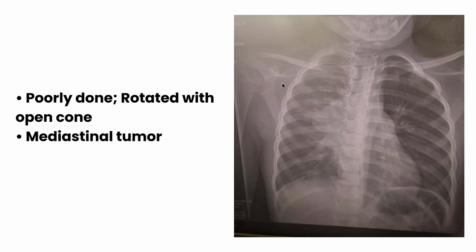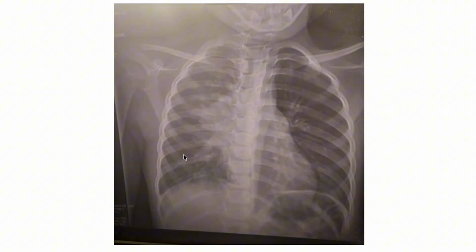In this case, you also realize that the coning was wrong, and we can see quite a bit of the neck and then also the chin. But that notwithstanding, there are some features here which we see. What do we see in this radiograph? Again, like I said earlier, quickly you look at the radiograph and look at the soft tissues, the bony structures. Are there any fractures? Are there any alterations in density?